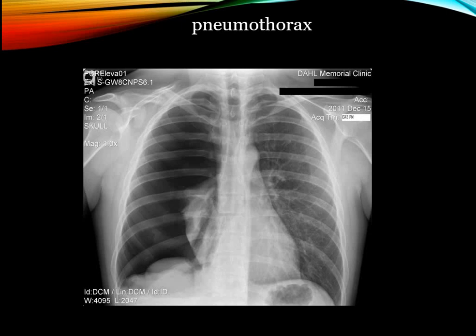Another example of the pneumothorax, right lung, all replaced by translucency that's devoid of lung marking. Where is the right lung? The right lung is the part which is marked by this red arrow. اللنج هي collapsed ومؤشرة بهذا السهم الأحمر، فهذا نيموثوركس.